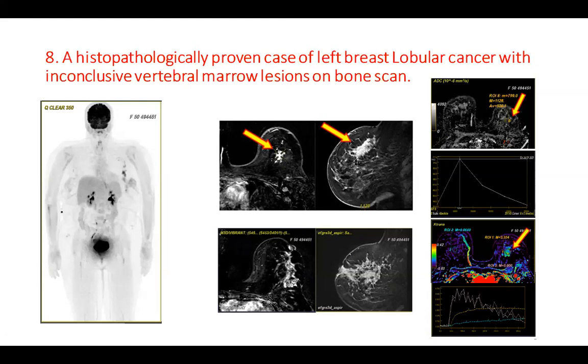So we have the dynamic study, and we have the diffusion, as we can see with the diffusion restriction. This is the ADC map showing the cellular packing related to the lesion, together with the abnormal perfusional status, or relatively hyperperfused state compared to the parenchymal perfusion on the contralateral side, together with the type 3 time intensity curve plotted.